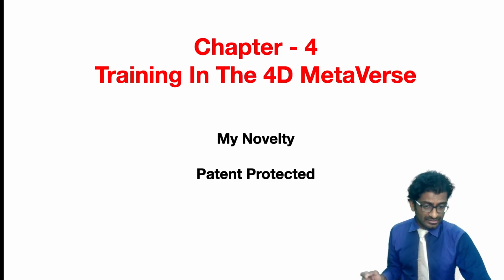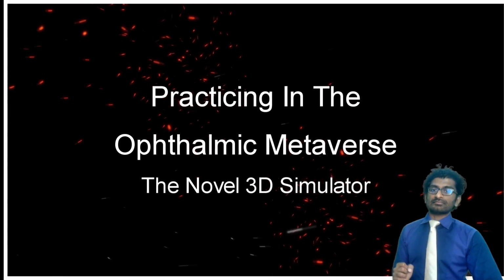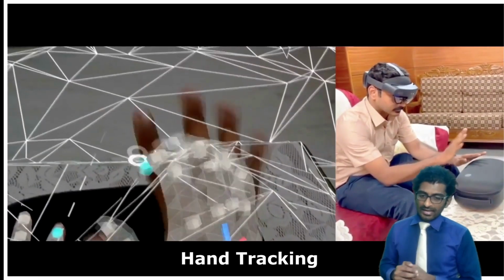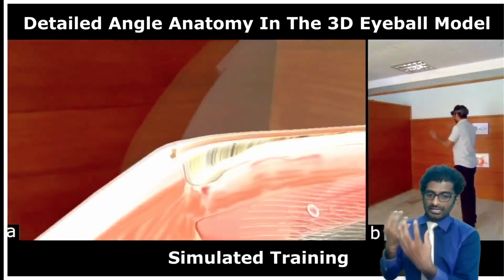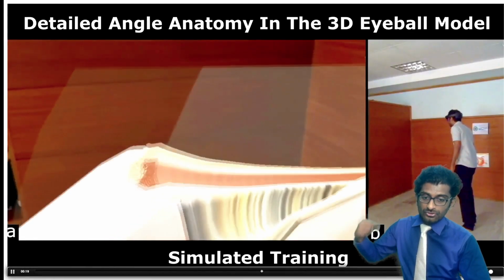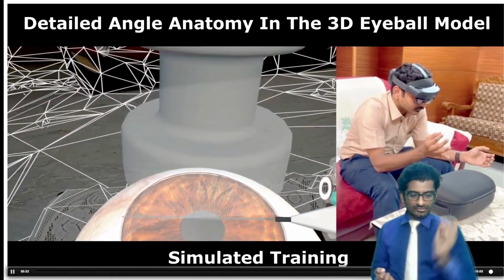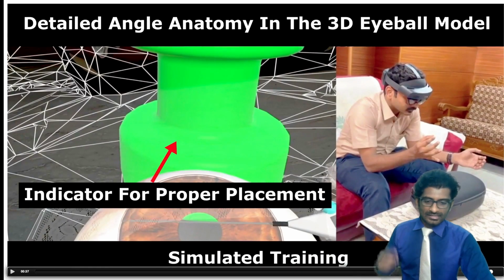And if you're looking at a good training simulation module for MIGS, we have our own surgical simulator, our novel 3D simulator. We call it the MIGS holographic 4D ophthalmic surgical simulator, which is the first of its kind, and it's a patent protected innovation of ours. You can see that you move your hands in real time, you will be able to code it in the metaverse, and our angle anatomy is recreated as close to human as possible. You can just take your stenting devices and go in and practice placing it in the right plane, not once, twice, but many times till you get your three-dimensional comfort, and now you can go into the real-time surgical scenario.